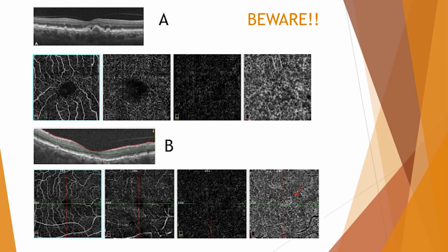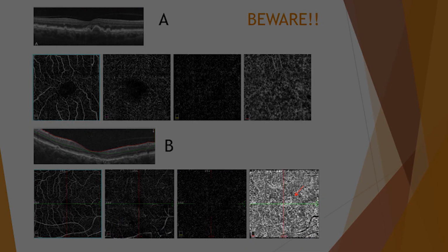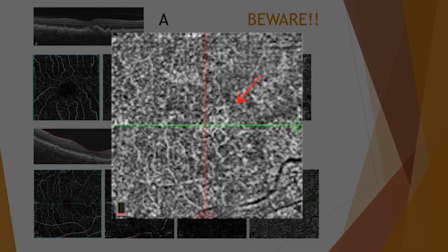The guy on top, A, who I thought looked worse, was actually fine. And the guy on the bottom, if you can see, he had a little baby net going on there. If you can appreciate that with my red arrow. And he also was treated.